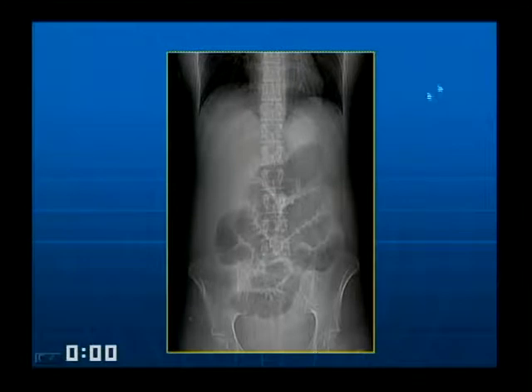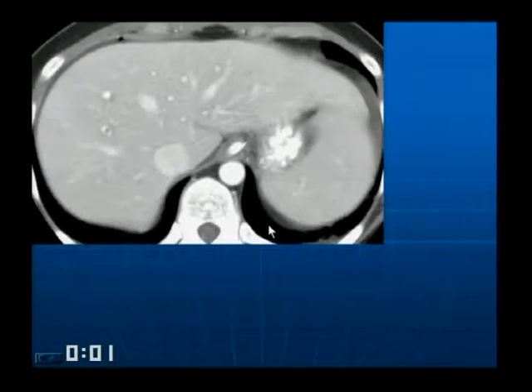And some gas seen in the small bowel. Is that small bowel normal? No. Folds are thickened, right? And there's also, the bowel is what? Relatively central in location. I would certainly wonder a little bit whether there was also ascites. There's a nasogastric tube in place. So we have some dilated small bowel. There's really no colon there. And let's see what else is going on.